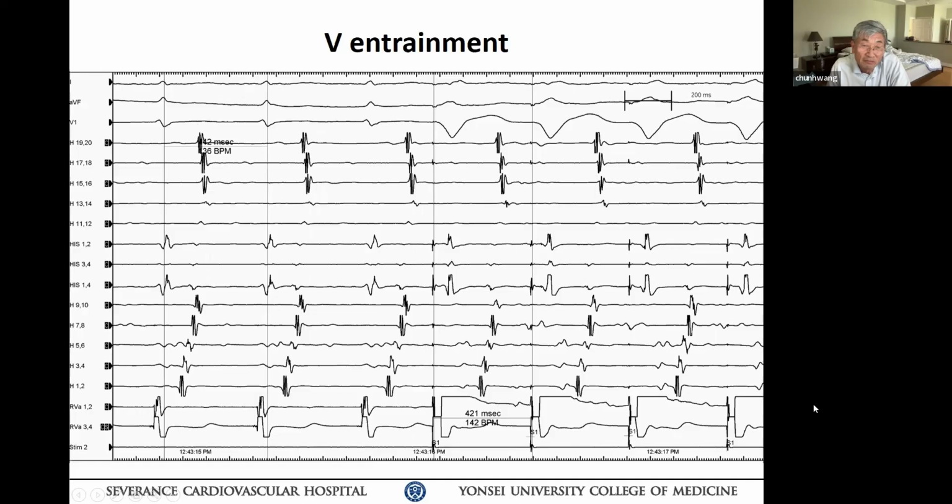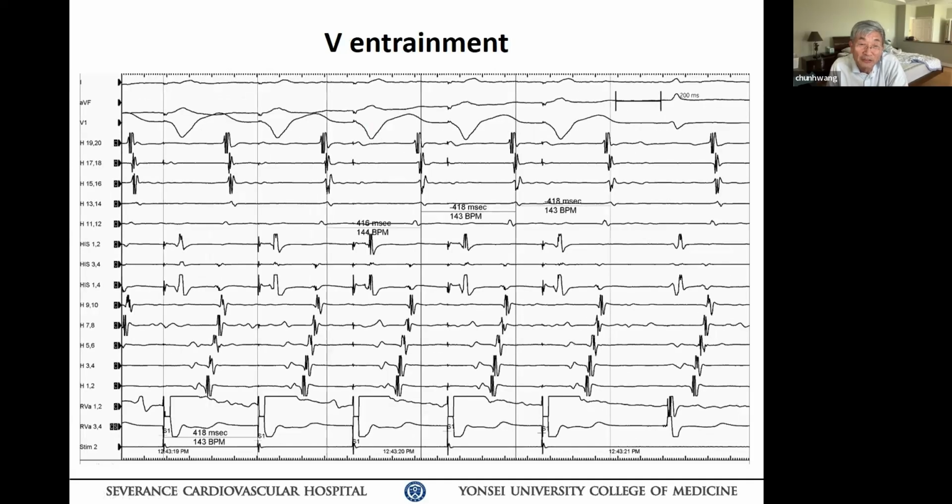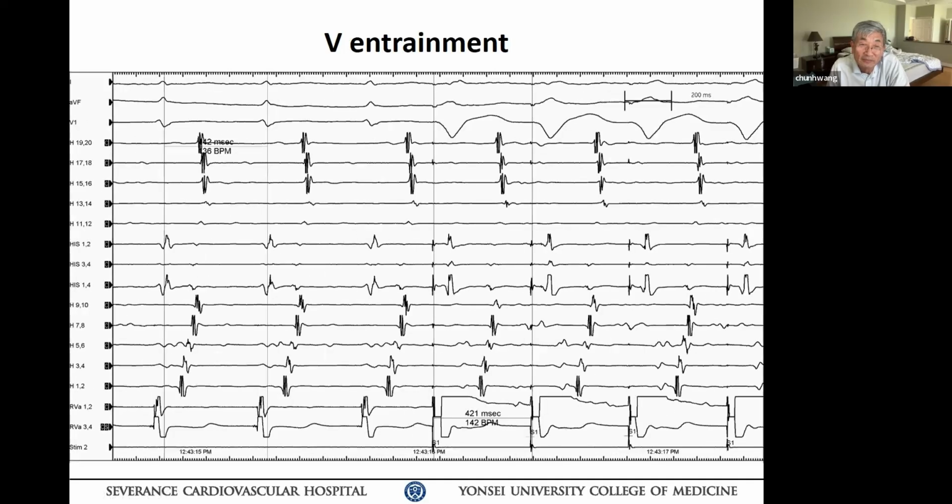This is just V pacing, okay? So you do V pacing. No, go back there. So with V pacing, what happened with the V activation during the tachycardia? Look at his channel. His channel is important in this one.